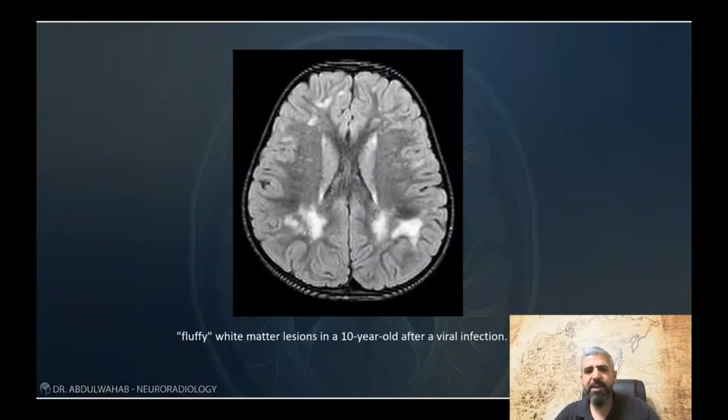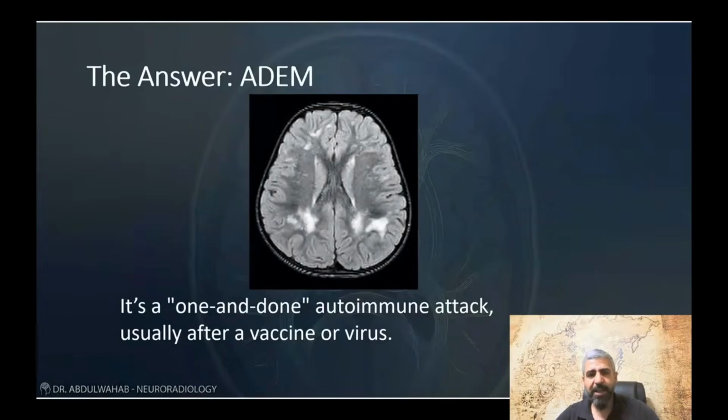Fluffy white matter lesions in a 10-year-old after a viral infection. Look at these lesions. They look like MS, but they are fluffy and involve the gray matter too. What do we call this disseminated attack? The answer is ADEM, or acute disseminated encephalomyelitis.